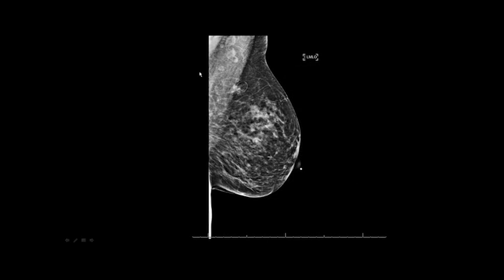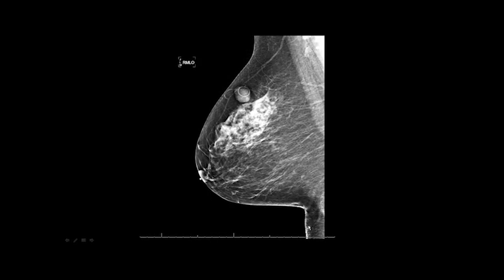I love this MLO view. Wide superiorly, convex border down to the level of the nipple. Make sure that you use your P&L measurements from the CC and the MLO view. The tail of the breast is up here. And the IMF's on there. I like it. Very pretty. I like this.